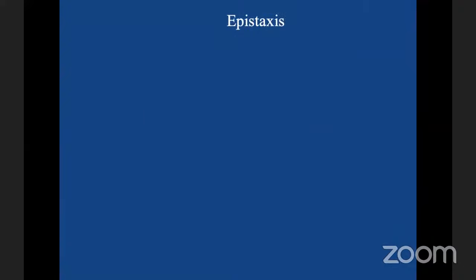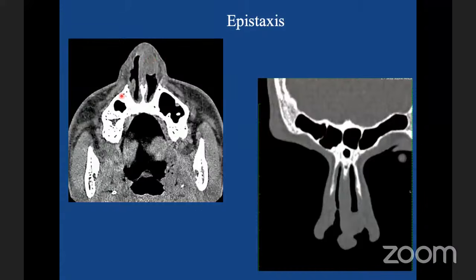Now, another case, another pathology. The patient presented with epistaxis. Axial image, plain coronal, the anterior-most part where you are not seeing the turbinate. So there is an oval soft tissue density lesion in the left side of the nasal cavity, abutting the nasal septum as well as the lateral cartilaginous portion of the nasal wall. What next? Stop here or do a CECT? Yes, you're going to do a CECT.